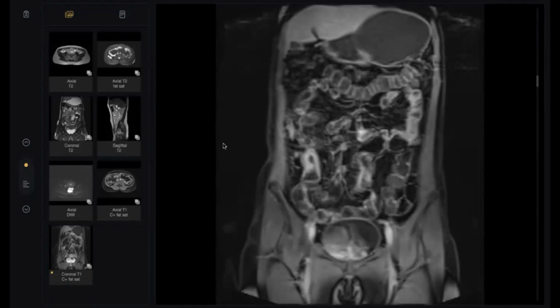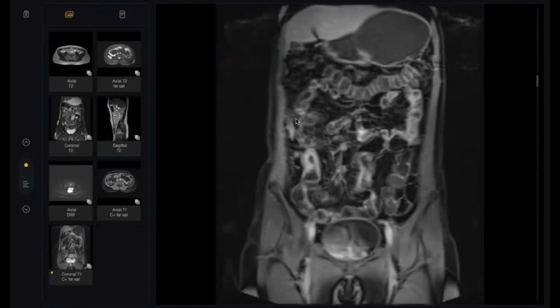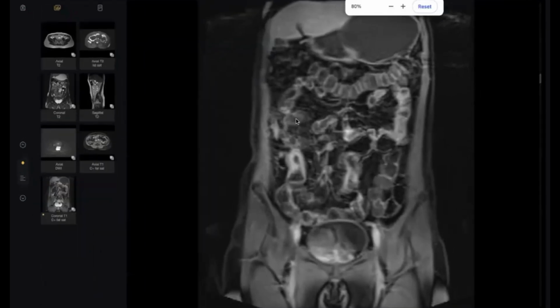Thank you so much, doctor. Doctor, this case is a big lesson for all of us. If the examiner informed you about the history, he means something important. Because in the exam, this is a very large case. Abdomen and pelvis MRI, at least in our normal practice, we need 15 to 20 minutes to report.